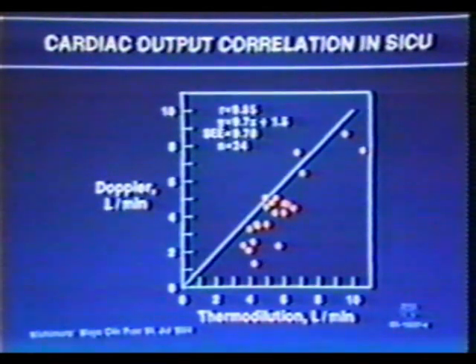For years, we have utilized measurements of cardiac output obtained via a Swan-Ganz catheter for prognosis and for management decisions with acute infarction. This important parameter can now be measured non-invasively.